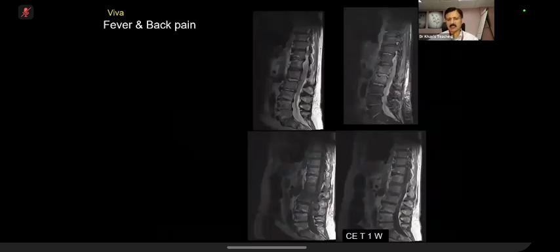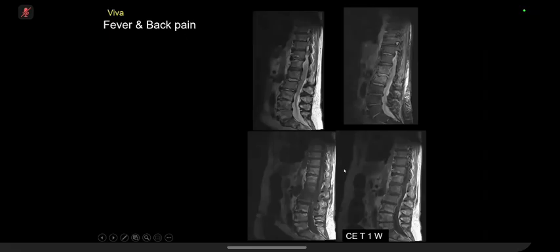On the other hand, this is a more important exam case. The previous case was just to develop your eyes. Now, in this case, we have a T1, T2, a STIR, a pre-contrast, and a post-contrast. What is happening? Look at this level. Looking at the pre and post-contrast images, I can see signal abnormality and also abnormal enhancement at the L5, 4, 3, 2, 1, L1, L2 levels, and also enhancement in the vertebral end plates as well as the disc, consistent with spondylodiscitis.